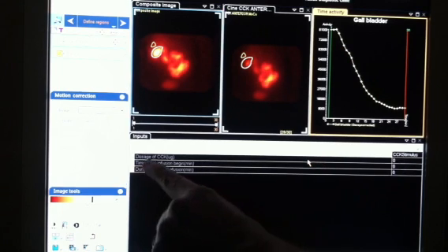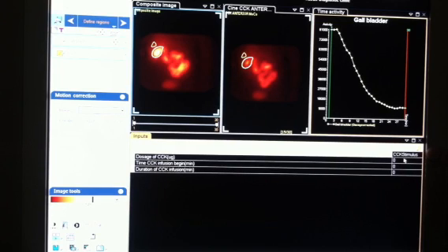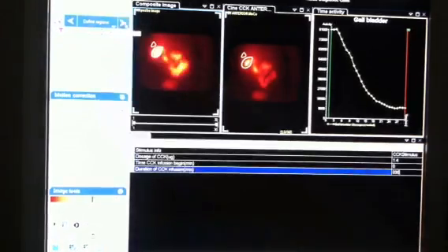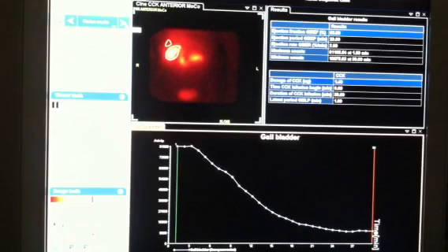Now what we want to do is add our dose of CCK, so we're going to check this little check mark over here, and we'll click this box, and let's say it's 1.40. And we want to do the duration of how long we did the CCK for. It's 30 minutes. Now once we have all this, we're going to go to this next step icon here. And it's going to bring up our curve. Alright, so we're at 86.6%.